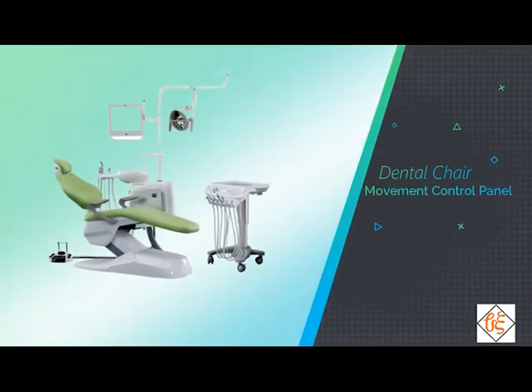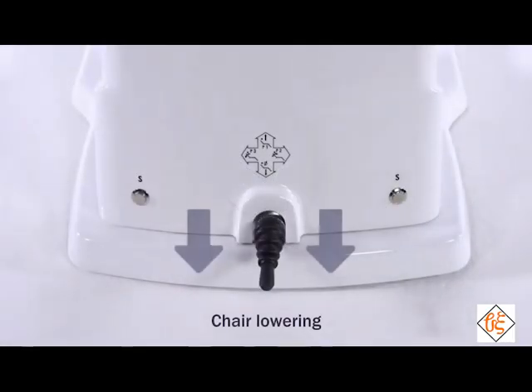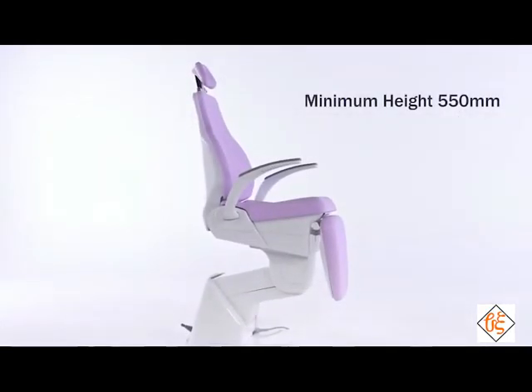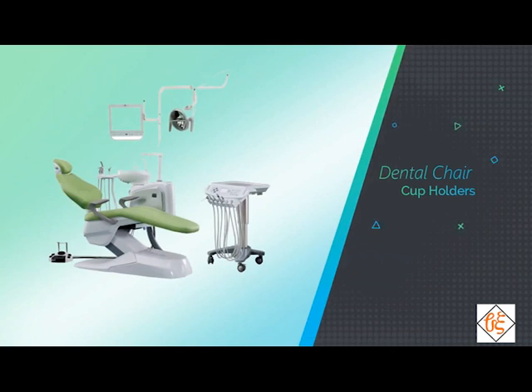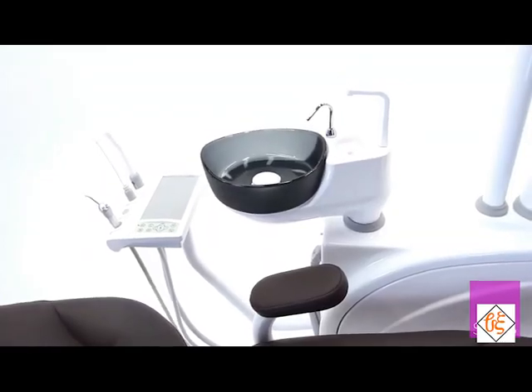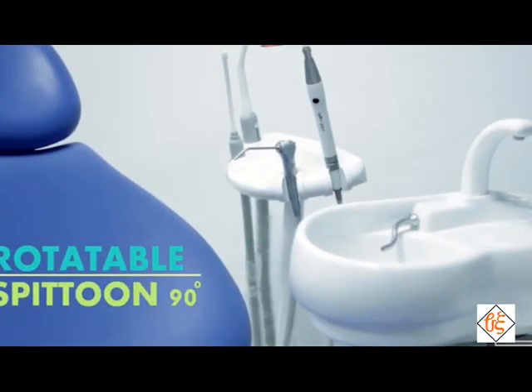The second component is the dental chair movement control panel. Dental chair controls are comprised of control buttons that can move the dental chair upward or downward depending on what is best suited for the clinician. The movements are move up, recline to rest, move down, lie down, lift, and raise the seat. The third component is cup holders. Every dental chair has a cup holder. Disposable cups are primarily used for patients to take in water, gargle it, and then spit it out into a spittoon bowl. This is so patients don't feel uncomfortable with blood or debris in their mouth.